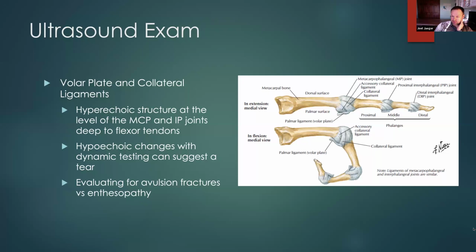This could be an enthesopathy. Those are things that can be more commonly seen in patients with psoriatic arthritis or a seronegative arthropathy. So those might tip you to think more of a rheumatologic cause.